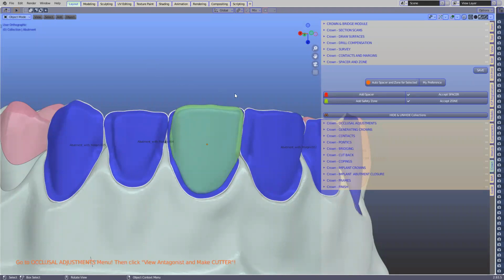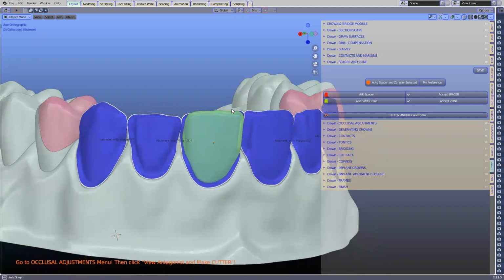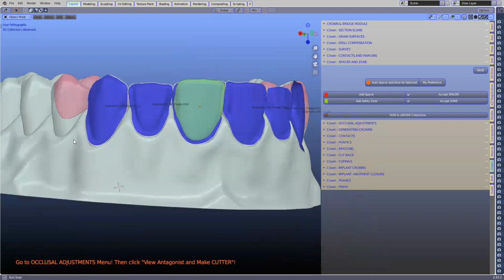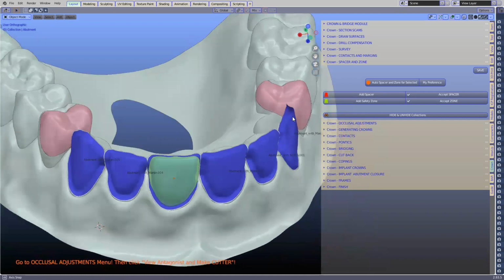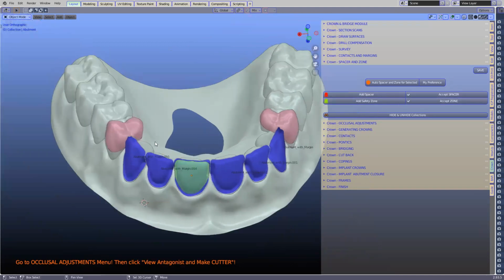So of course the goal is to take the mesh of the tooth library so you don't see any green, because then you know that your veneer is thick enough. If you see the green, then you know you're risking a too thin veneer prep. So that's all, it's just indicative. Of course you can select all of them in one go and hit this button, and it will take this one and this one and this one and do it all in one go. And then you've got the default values.